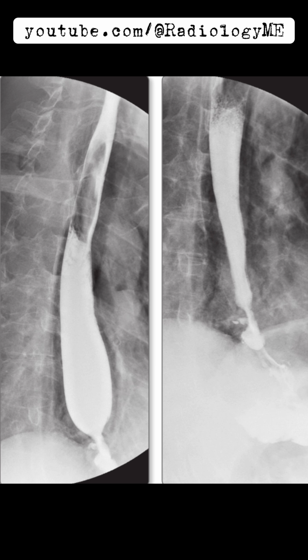I'm considering two possibilities. One, this could be iatrogenic, especially if the patient recently underwent an endoscopic procedure, particularly one involving dilatation of an esophageal stricture. That's a known risk factor. Or, alternatively, we could be dealing with Boerhaave syndrome, a spontaneous esophageal rupture, though that classically follows vomiting, and I'd need to check the history for that.